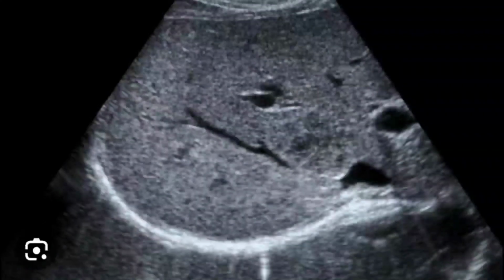This ultrasound image shows hemochromatosis status. Look at the image. This is the image of the liver and it shows increased reflectivity. As far as iron overload status is concerned, whether it is due to hemochromatosis or due to increased blood transfusion in case of hemosiderosis, in both conditions the liver will appear slightly echogenic, but it depends upon the degree of the stage. Like in hemochromatosis, as I mentioned earlier, it will lead to liver cirrhosis.